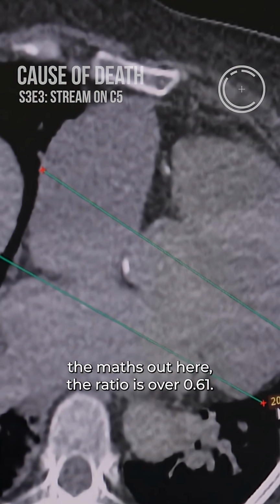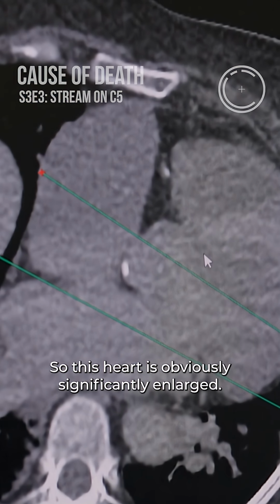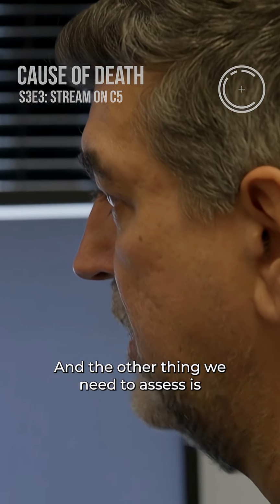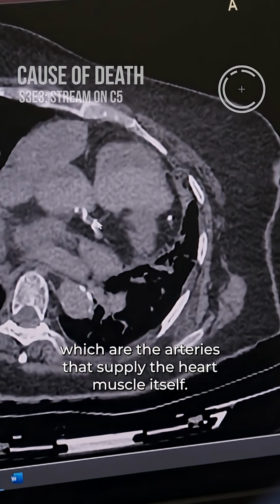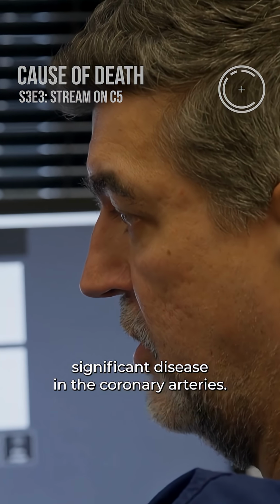When we work the maths out here, the ratio is over 0.61. So this heart is obviously significantly enlarged. And the other thing we need to assess is the coronary arteries, which are the arteries that supply the heart muscle itself. And we can see that there's significant disease in the coronary arteries.